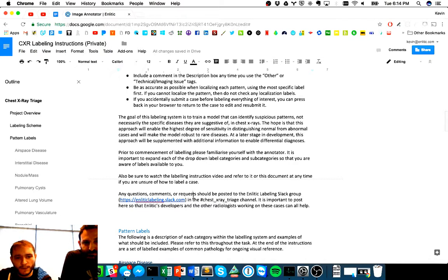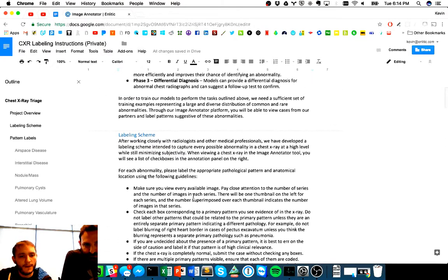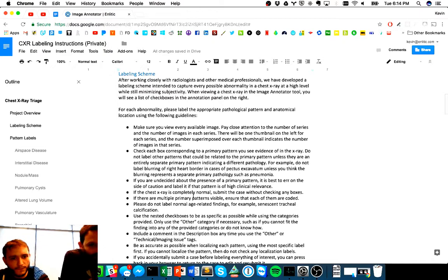But as we mentioned, the real purpose of this video is to offer you further guidance beyond this document to help you in labeling these cases. So to begin, we can start to walk through some of the specifics of the labeling scheme and some of the particular guidelines that we've set forth that we recommend when looking at each of these images. Yes, so really the most obvious and first thing to do, and some of the areas that we've seen to this point, is you need to look at every image that's provided. There will be abnormalities that require labeling on both the frontal and lateral views.